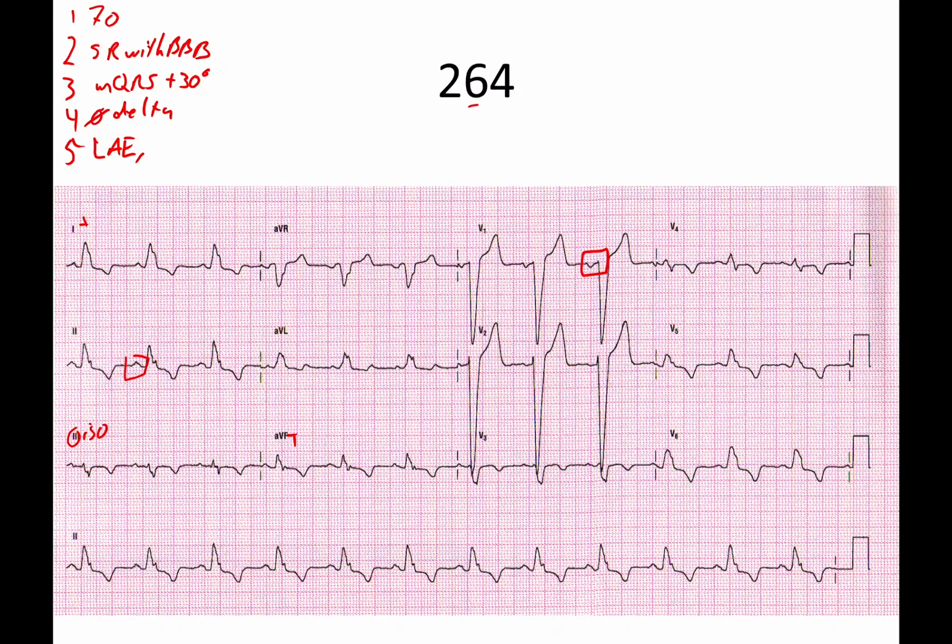We'll look for right and left ventricular hypertrophy. Looking in V1, do I have the R to S ratio? Absolutely not. I do have the scenario where I could count these out and be 5, 10, 15, 20, 25, 30. We could easily make the case of saying that we have greater than 35 millimeters, but we're dealing with a bundle branch block, or we think we are. And so at that point, I can't guarantee that it's a left ventricular hypertrophy until I know whether I have a left bundle branch as well. So we'll just do question mark left ventricular hypertrophy.